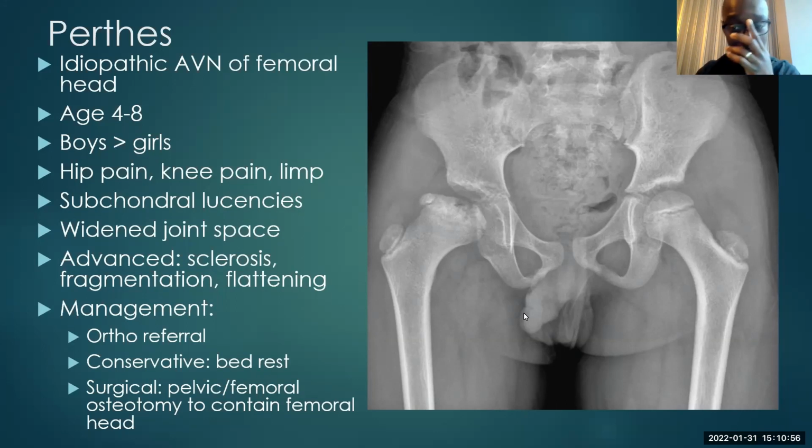Yes, they are coxa magna, yeah. So actually, to be fair, not much in the way of coxa magna. I mean, I could measure it. Eyeballing it, there's a bit. But yes, to answer your question, I'd say that it's a common phenomenon in advanced cases because the biomechanics are all thrown off because of the advanced flattening and sclerosis of the femoral head. Orthopedic review for sure.